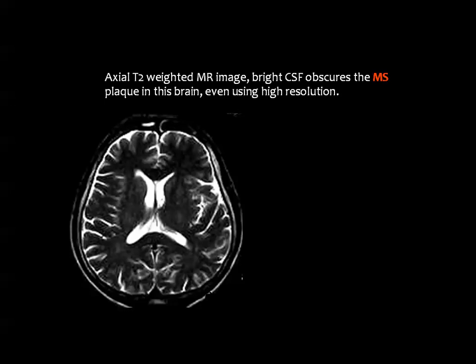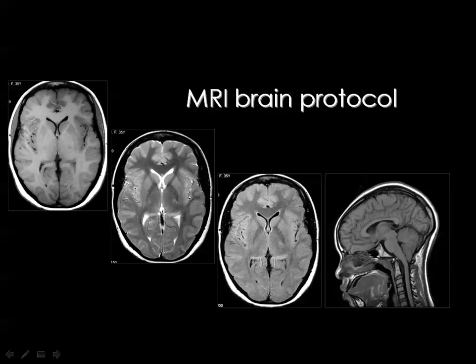I have mentioned that the regular protocol of the brain includes the axial T1, axial T2, and the axial FLAIR images. What is the value of the FLAIR images?